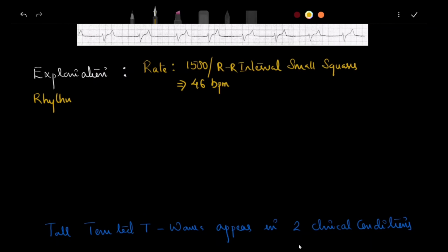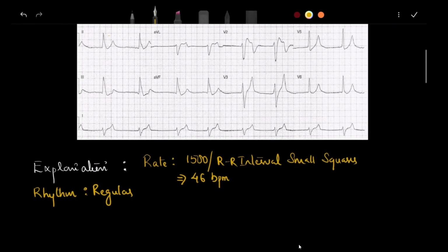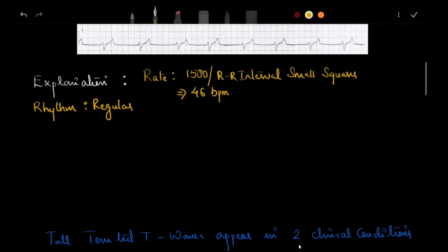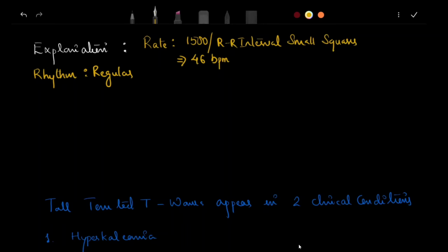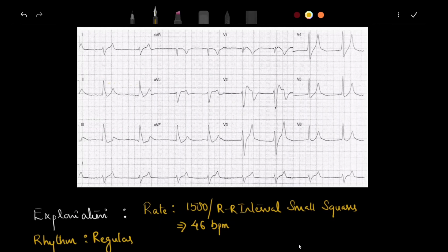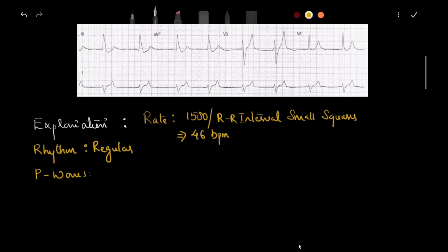We can find that the rhythm is regular. It's clear that the rhythm is very much regular. About the P wave: can we find any P waves here? No. So the P waves are absent.